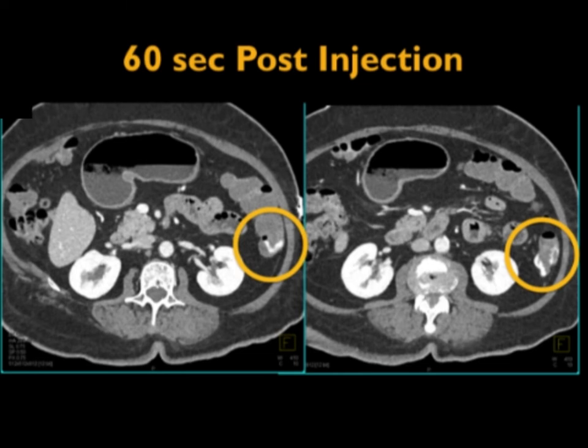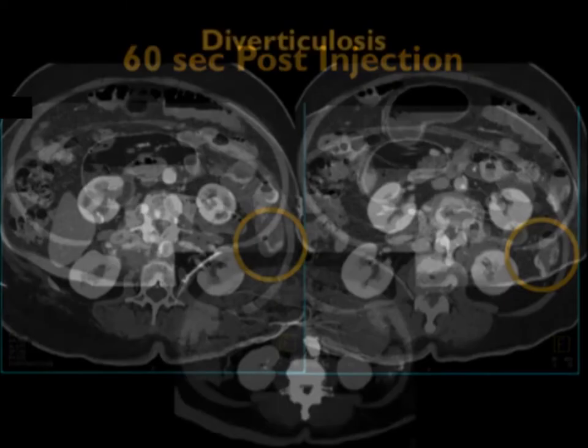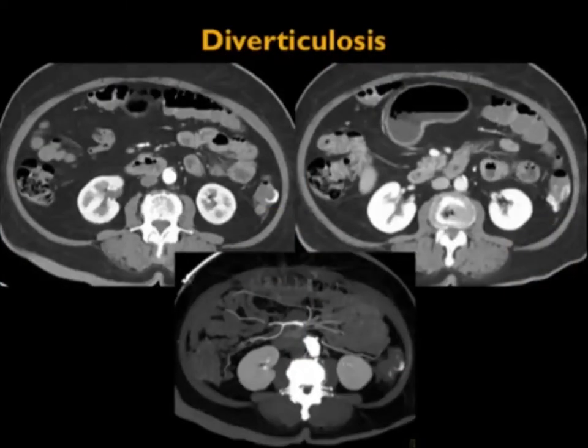Now, there are many things with diverticular disease. Probably diverticular disease is the number one cause of bleeding in patients, number one or number two, competing with angiodysplasia. Here's a good example showing you that axials can show the bleed, though looking at the MIP imaging makes life a whole lot easier for everybody. It may be easier to appreciate.